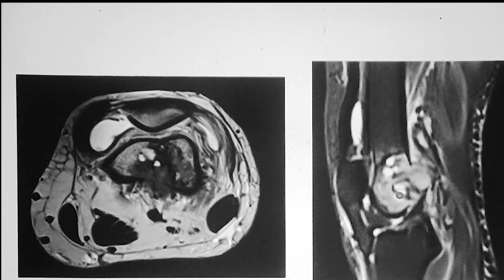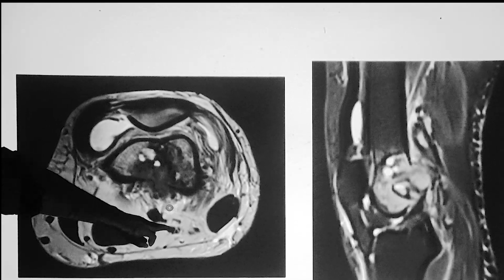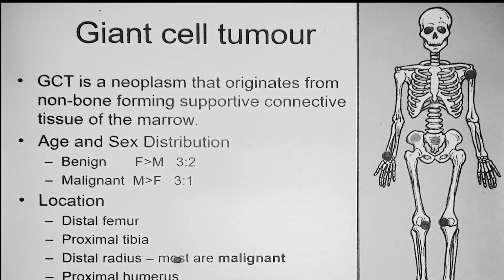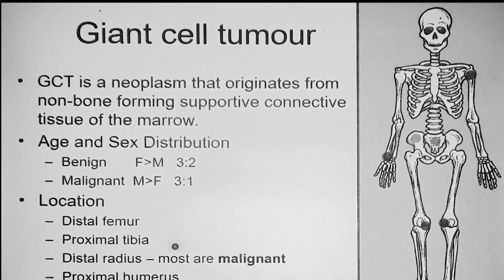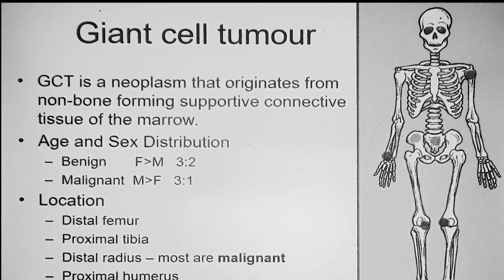The distal femur is the most common site here, presenting as in this case. But the sacrum is the most common site for GCT in the axial skeleton.